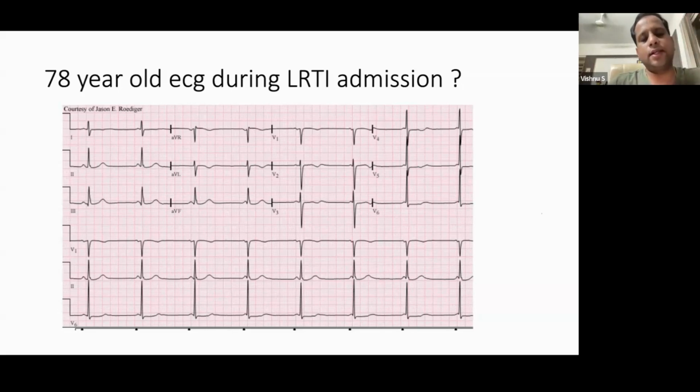This is the same thing I just mentioned. Does this P wave produce the QRS or not? Is it possible to have such a small PR interval for this QRS, or is it a junctional beat with independent sinus node firing but not conducted? What is the possibility, and what is the name for this phenomenon? This is a classic ECG.